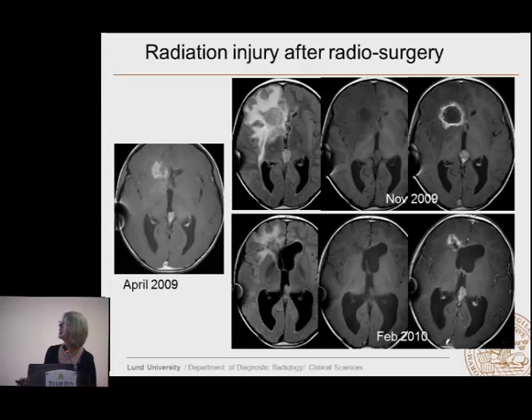This is the initial study. He goes to radiosurgery. And you could see here in November that now he has this focal ring-enhancing lesion, a little bit of a feathery appearance again of the contrast enhancement, not sharp borders, and he has a significant edema. This patient was just followed without any further treatment, and you can now see there's a shrinkage of this area where he had radiosurgery, and there's also a decrease of the FLAIR abnormality.